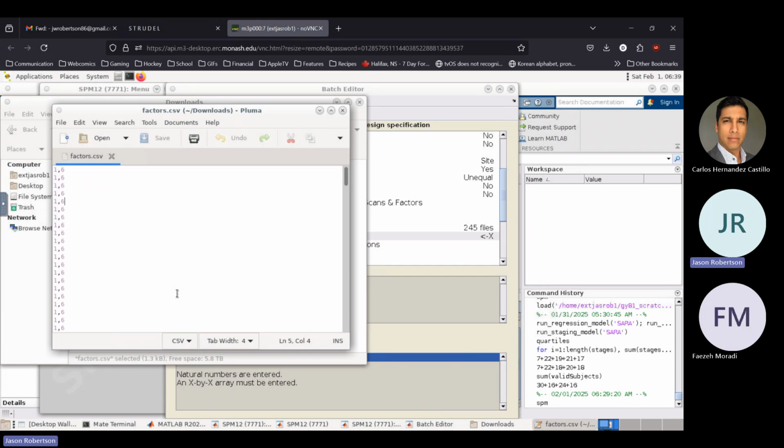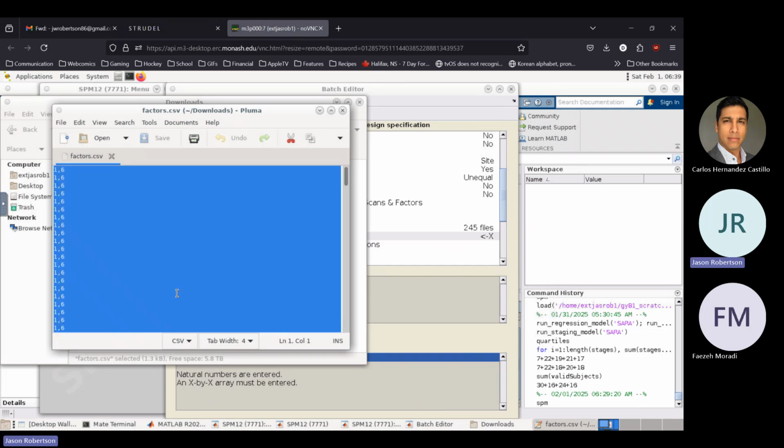What's going to happen is when we put those factors in, it's going to create dummy variables like the ones you saw in the presentation. When you have a simple binary 1 and 0, that's called a dummy variable because it's basically representing a group rather than a value. So does everybody understand what a dummy variable is? Yes, it has zeros and ones, so it's going to fill up the other ones with 0 and 1.